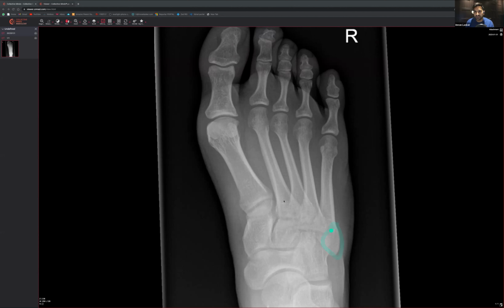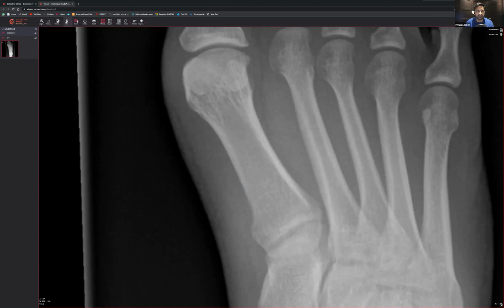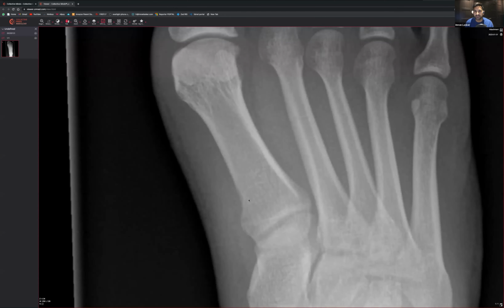And then you want to just really trace along the actual shafts. That's my next key area, really trace along the shafts. And again, you just want to zoom in and make sure that you've had a really good look around. So if you've seen it, then let me know. If you haven't, don't worry. We'll kind of go around like so. There's no osteochondral defect or anything there. This all looks okay, and actually this aligns quite nicely.